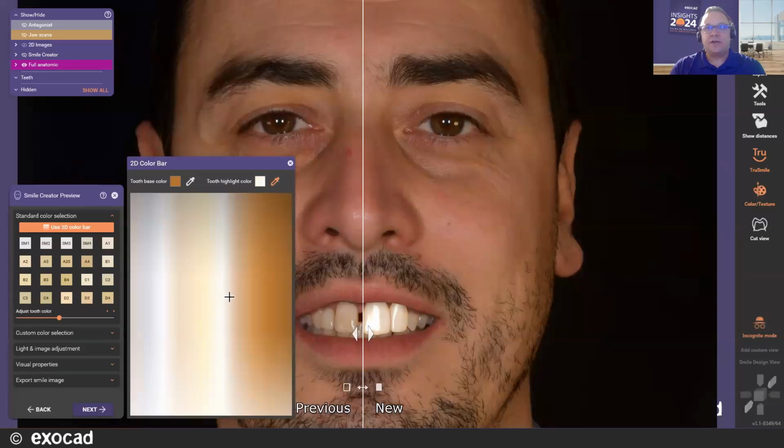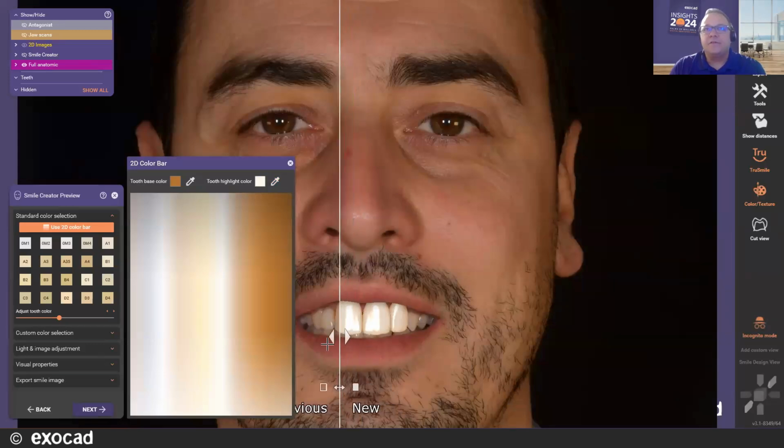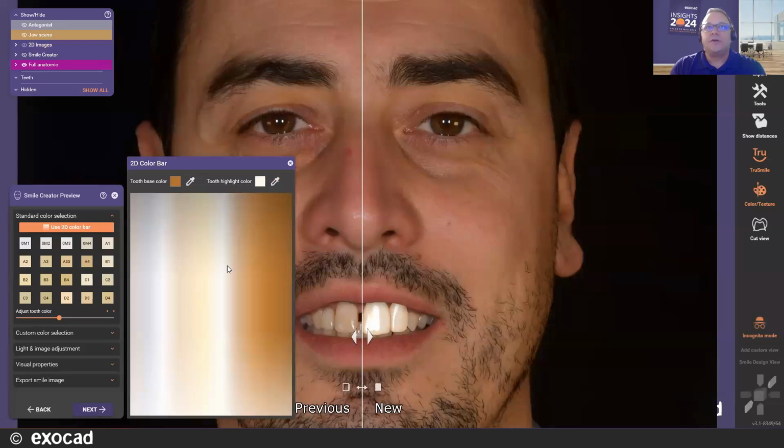And I'm just left clicking and dragging my mouse till I find a representation that I like. So instead of a monochromatic representation, you'll actually be able to see more of a transition with shading and give a little bit more of a realistic rendering. So this is a really great feature. I definitely love to use it in those regards.